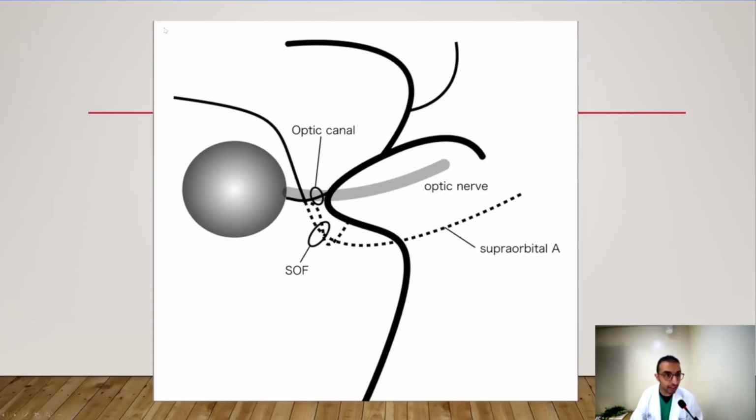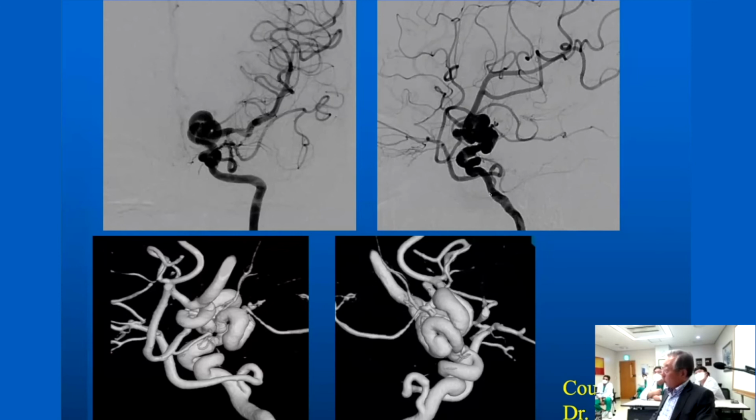Let me just show you one case. The carotid artery giving off this branch, is this eventually going into the inferolateral trunk, or could it be becoming the ophthalmic artery? The inferolateral trunk is at the cavernous segment. It is far below. There is a small branch going backward. So this is before the cavernous sinus.